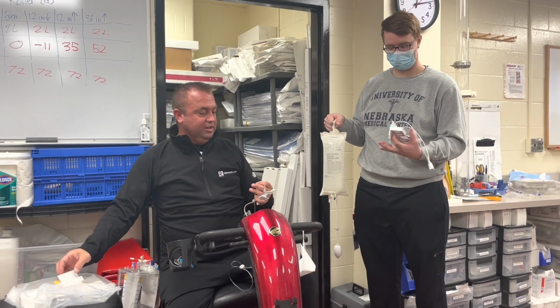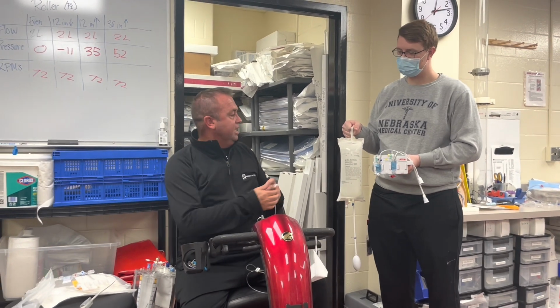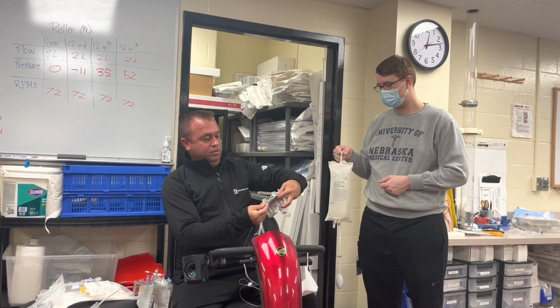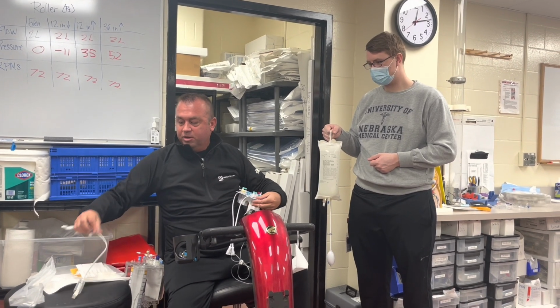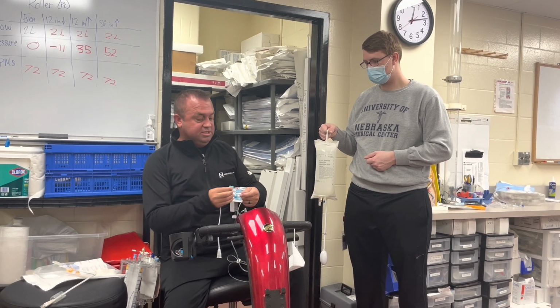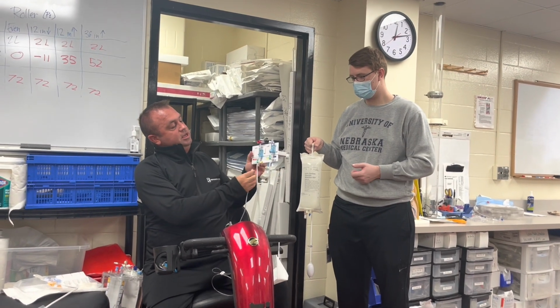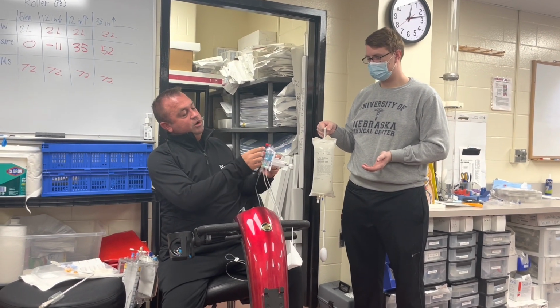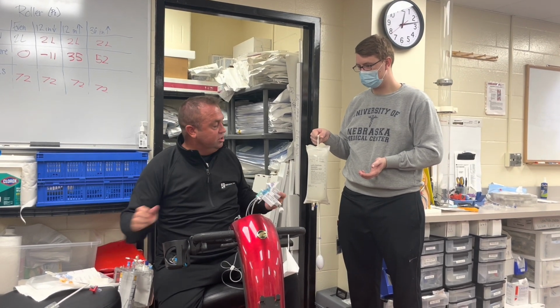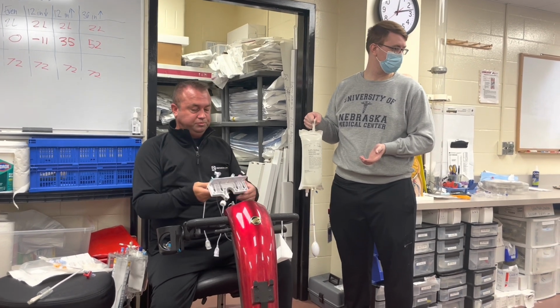So I'm just gonna take that transducer set and I'm going to use one of these, male to male here. I'm going to set this transducer up here. So now our spike will go into this transducer. Eileen, grab me one piece of pressure tubing here, would you please? Okay.